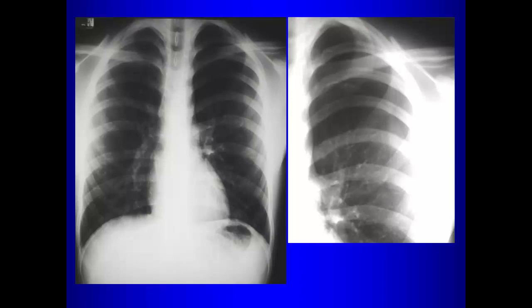Well, I did give you a close-up of the left lung, so that would suggest that there's a problem here on the left lung. Pneumothorax. Yeah, so there's a pneumothorax here. This thin white line indicates that this is a pneumothorax. What does this line represent? Visceral pleura. That is the visceral pleura, right.